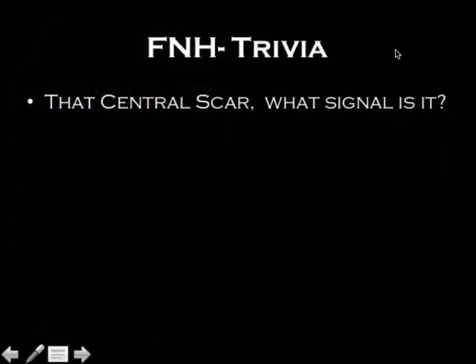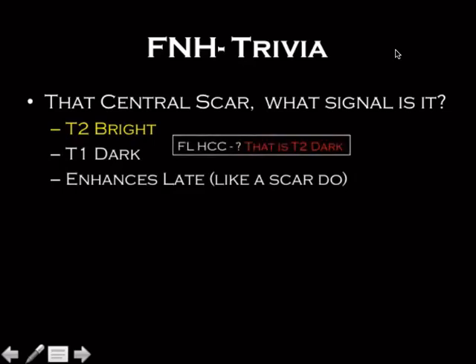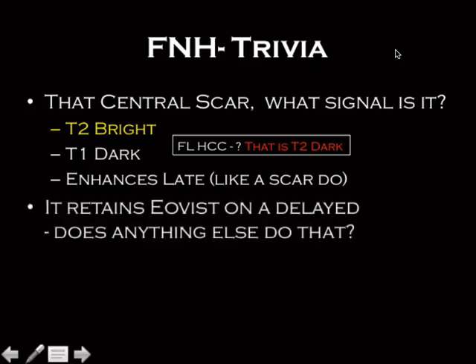So what do you need to know? That central scar, what signal is it? Yes, I do know what signal it is. It's bright versus the fibrolamellar HCC, which is classically dark. It enhances late, like a scar does. If you know any cardiac MR at all, you know that is a principle, that scars do enhance, typically later. It retains Eovist on a delayed scan.